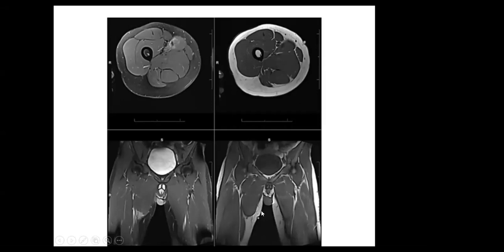And sometimes this bunching up can lead to a false diagnosis of soft tissue sarcoma. This is the reason why we did this MRI scan on this patient, because the muscle was completely torn, retracted, and had a mass-like appearance.